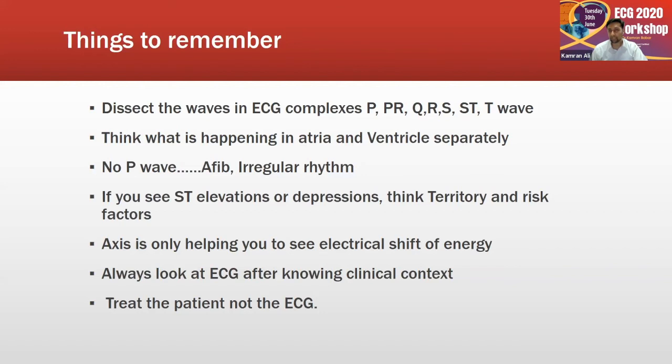Make sure that whenever you're seeing ECGs of a patient, it's the right patient with the name and demographic information, because you don't want to spend time on the wrong ECG for a wrong patient.